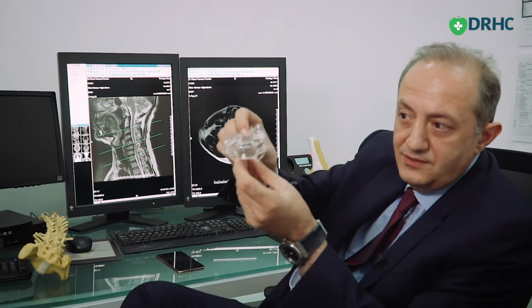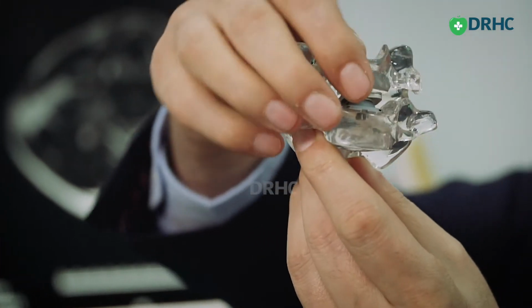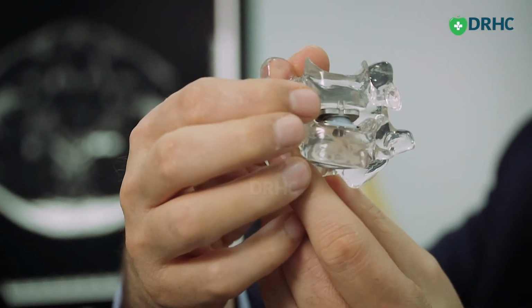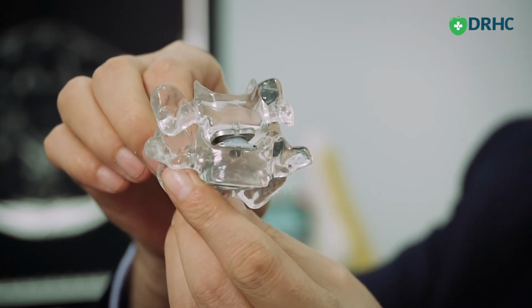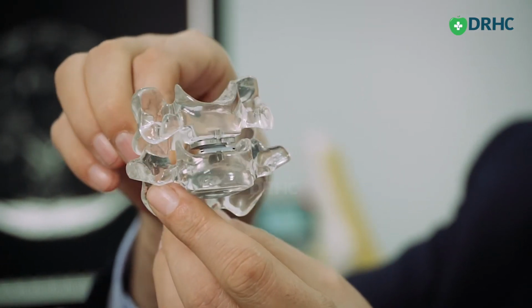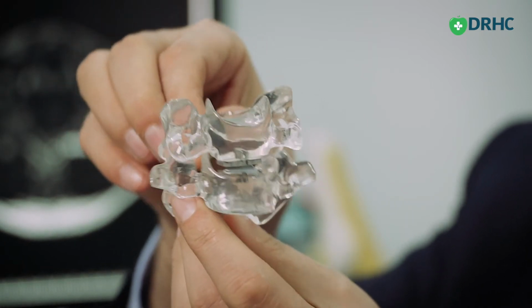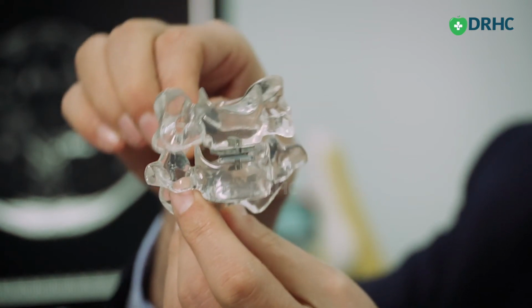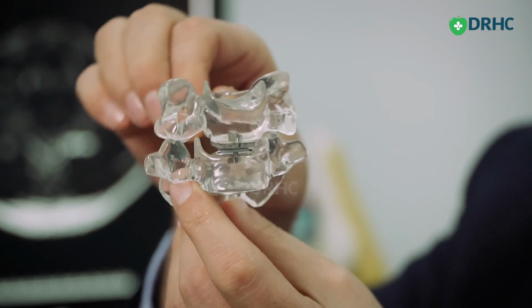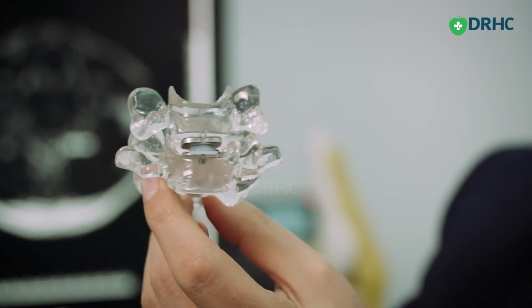As you can see here, these are the 2 vertebrae, and we put in this artificial disc replacement, a piece of art actually, which has changed the practice in spinal surgery significantly over the last 10 years. You can see I'm moving the vertebrae on each other, and the disc space is allowing all this movement to happen. So we preserve movement and we preserve the anatomy over time.